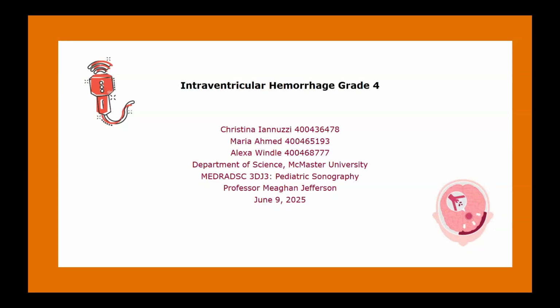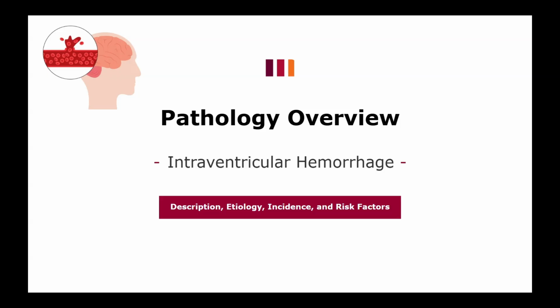This is our presentation on intraventricular grade 4 hemorrhages. In this presentation, we will cover all you need to know about intraventricular hemorrhages, including pathology overview, sonographic appearances, additional imaging, and outcomes. Pathology overview: intraventricular hemorrhage description, etiology, incidence, and risk factors.